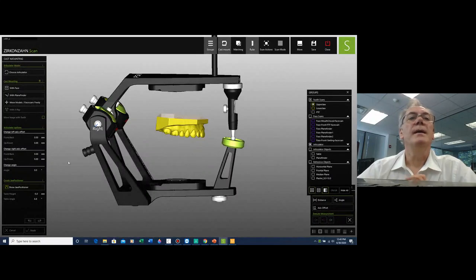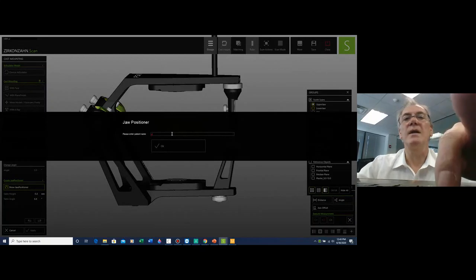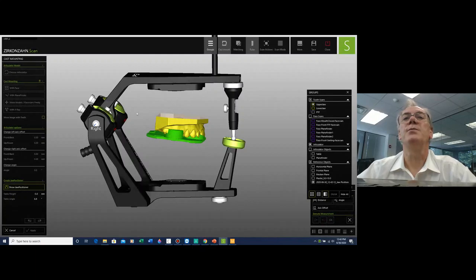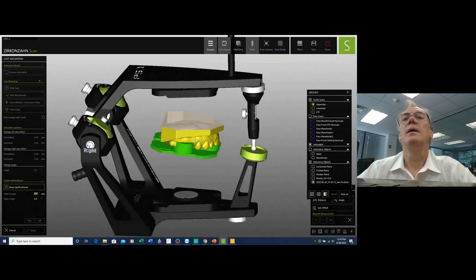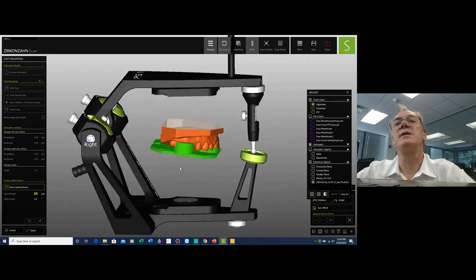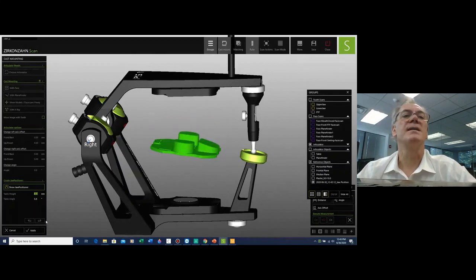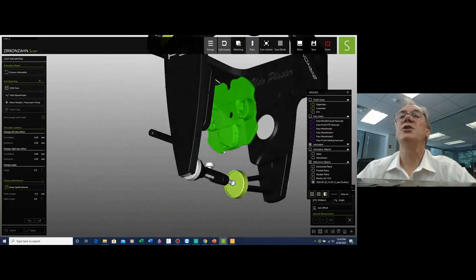So here again, we show the jaw positioner, and we're just going to call it AAA today, it doesn't really matter how we name it. And the computer sets up our jaw positioner, which by left clicking, we activate the jaw. We are telling the computer basically to create an imprint. I'm just going to take it away a second so we can see what happens. And if we go to apply, it generates an imprint of the model in that exact same position.